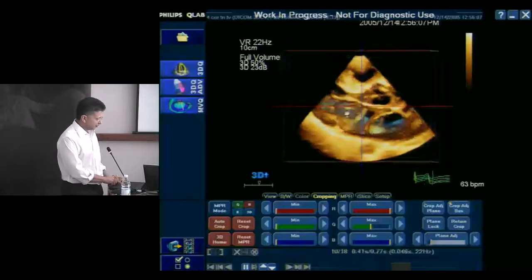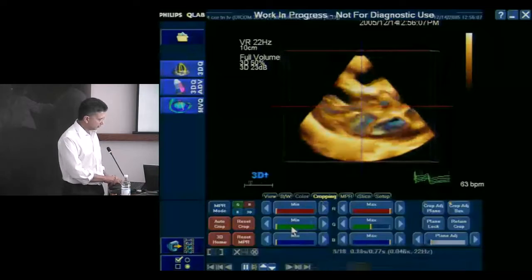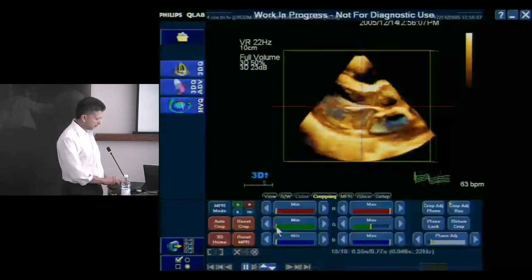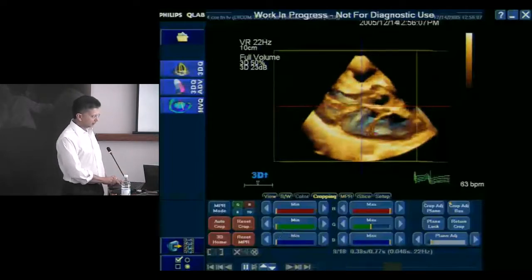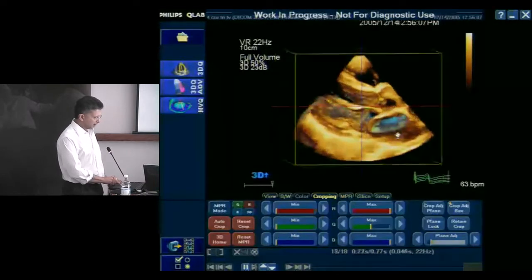All right. So this is a full volume. I've already cropped it, and I've done all of my image manipulations to it, and so on. So just for the 2D world, that's the way that looks. And really, there's not much that we're going to be learning from this. It's just a beautiful demonstration, so I just wanted to show you that more than anything.